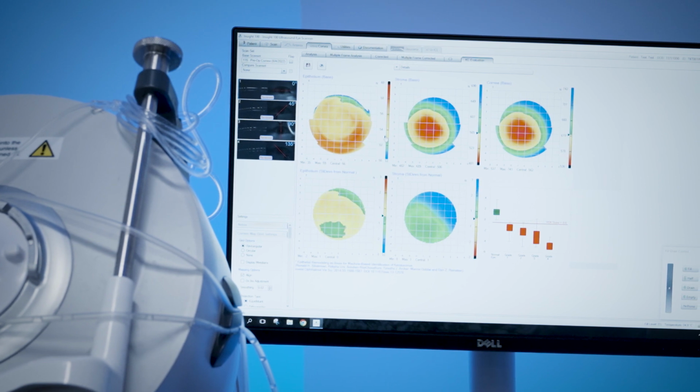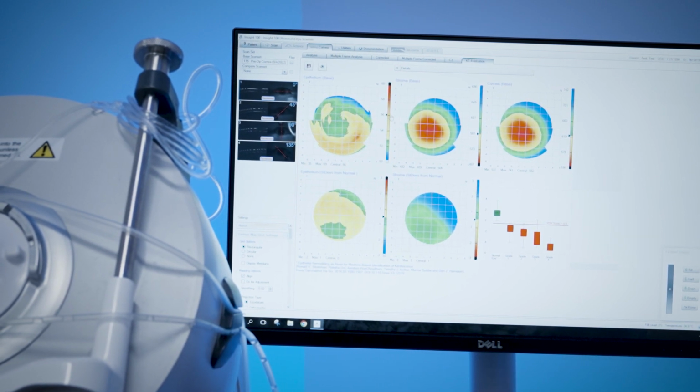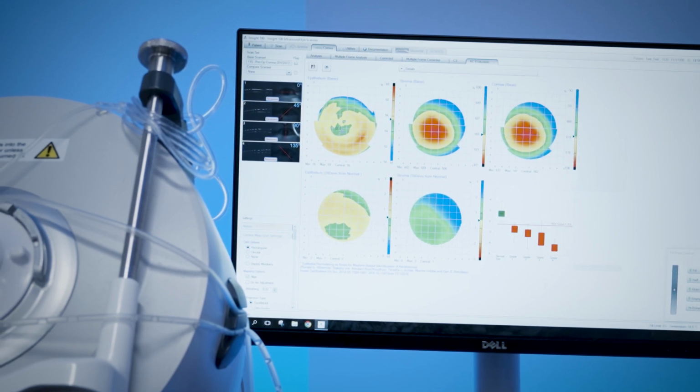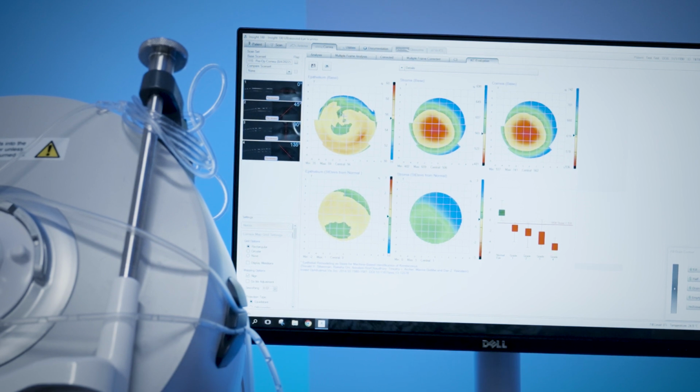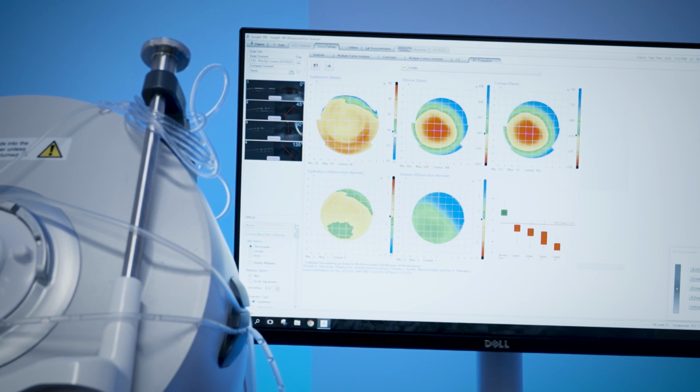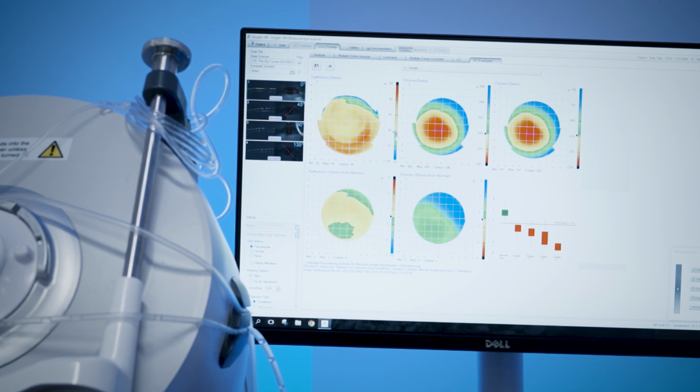So it just gives us a little bit more power so that now we have different colors here that we can see. Now it highlights here 55, 58, and this is steeper. So what we want to do is you can now adjust this arrow here to see. So what I usually look for is the first area that becomes the thinnest, that becomes thinner. So we don't care about this part because it's not relevant, because look at the scale here. This is 10 millimeters out here, okay, 0 to 5 here.